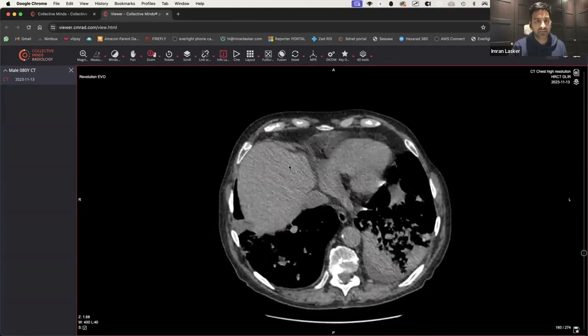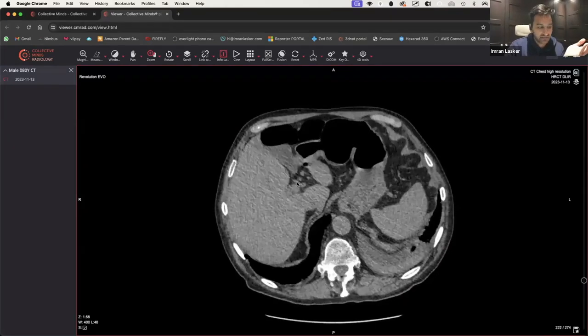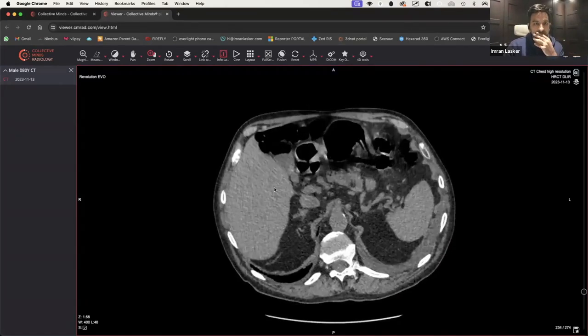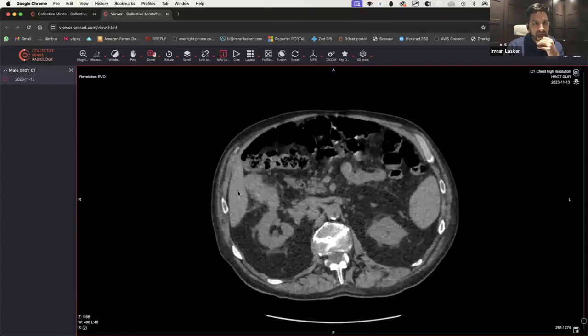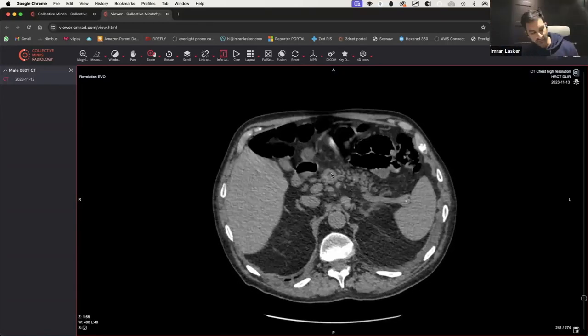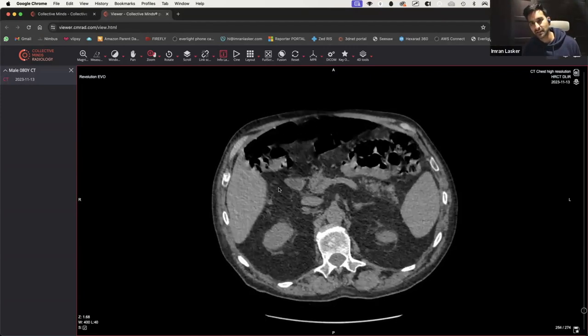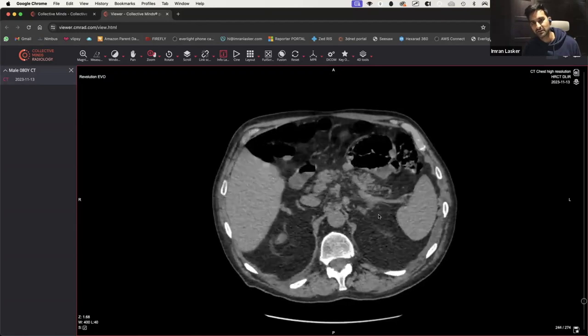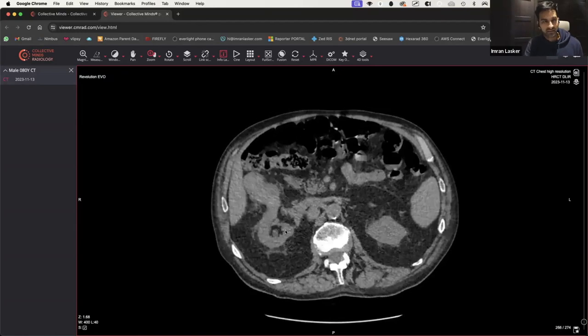So then we have a look at the liver, and it's a non-contrast study. I get it, it's not going to be entirely easy to figure out what's going on with regards to the kidney and the liver. But the liver looks okay. The pancreas, sometimes you get pancreatic malignancies, but that looks kind of fatty and slightly nodular, but all right. No focal lesions. The spleen looks okay. And the adrenals, which are here and here, look okay as well. But someone's hit the nail on the head.